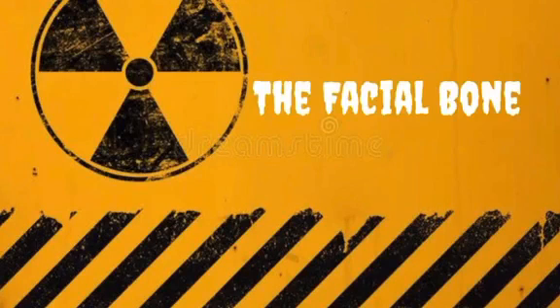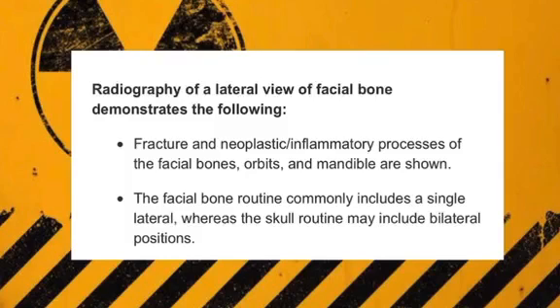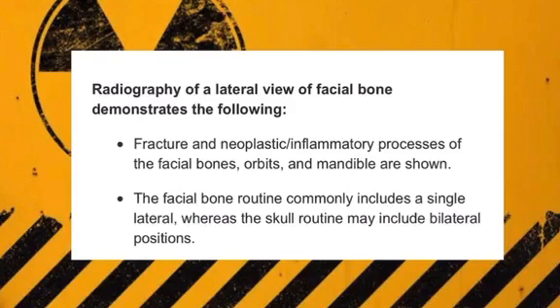The facial bone in lateral projection. Radiography of a lateral view of facial bone demonstrates the following. Fracture and neoplastic or inflammatory processes of the facial bones, orbits, and mandible are shown. The facial bone routine commonly includes a single lateral, whereas the skull routine may include bilateral position.